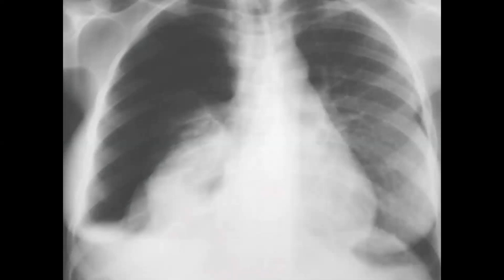Then, I don't know, let's see if I can show you the lung. So this is the lung here. Basically that's all that you're able to appreciate on this image. I wish I'd put the other image that showed the visceral pleura, but it's not here. So basically we're able to appreciate the increased translucency, the absence of vascular markings, and the pneumothorax is in the apical region.